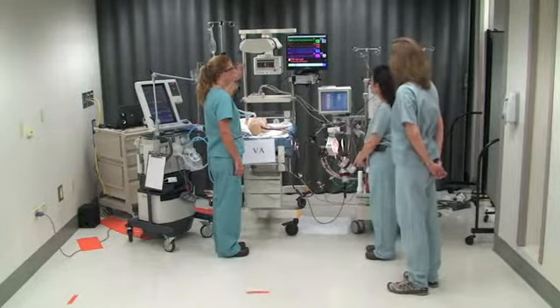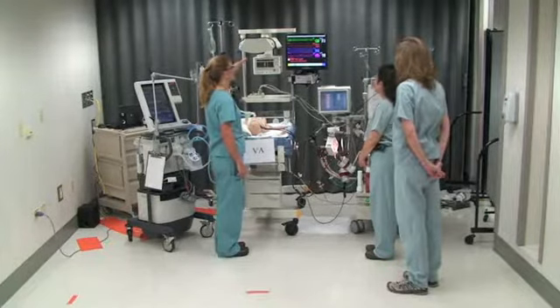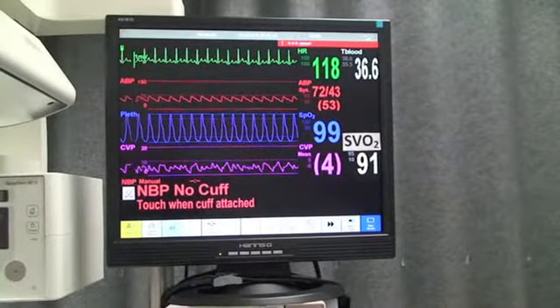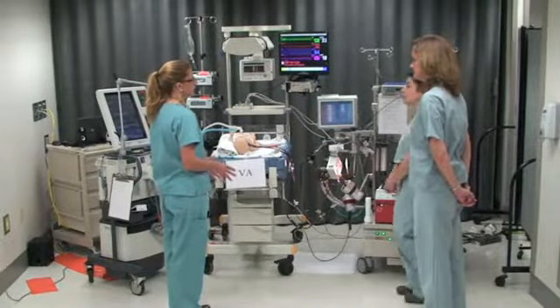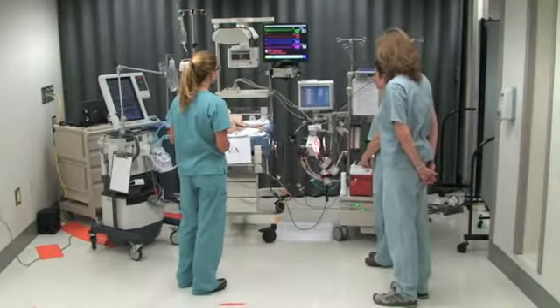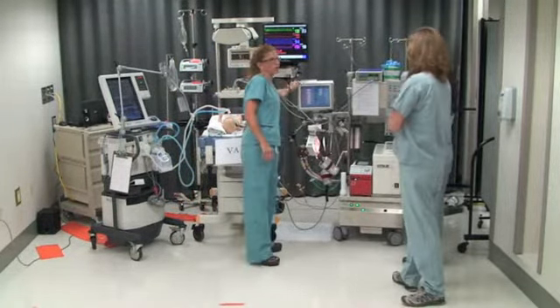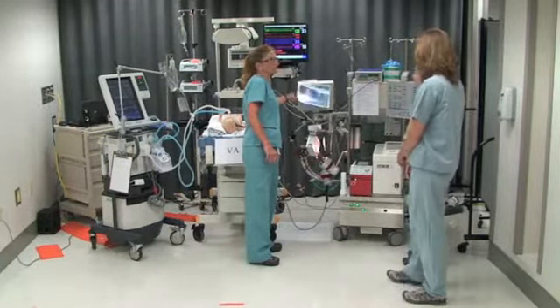It looks a little bit differently than what we use in the clinical setting. So just eyeball right now where your heart rate is, blood pressure, sats. Your temperature will also be posted up there, and your CVP. To get you started, we're going to let you all do a circuit check, which is going to familiarize yourselves with the circuit. Everything that's on the ECMO circuit is on and running. The exception to that is the CDI monitor. So for the CDI monitor, we're going to hang some signs for you to reference.